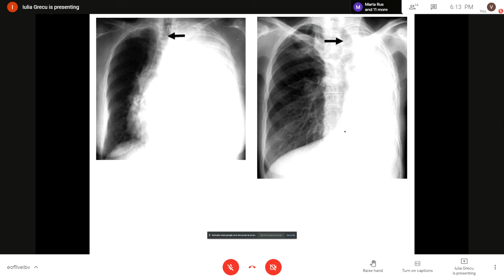The mediastinal shift. Okay. And how is it in this picture compared to the other one that we discussed before? Which way is it shifted? Is it towards the opacity or away from the opacity? Towards the opacity. Towards this massive opacity that fills the entire left hemithorax.